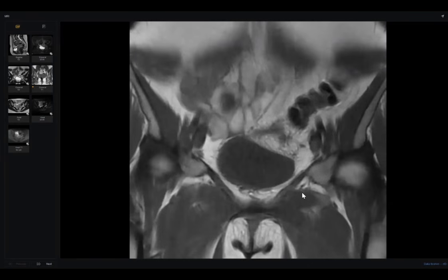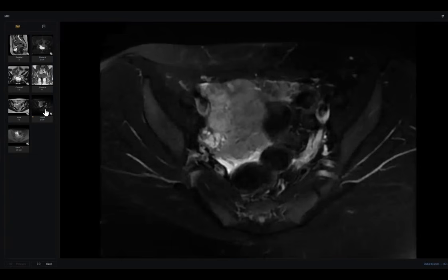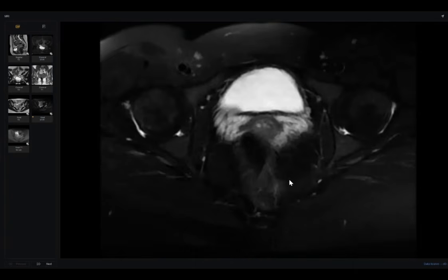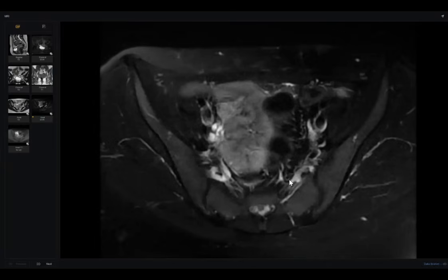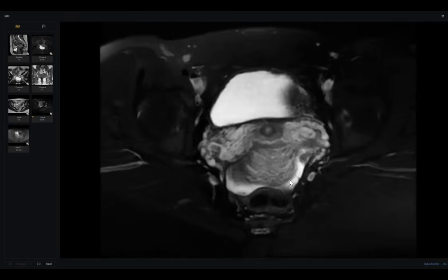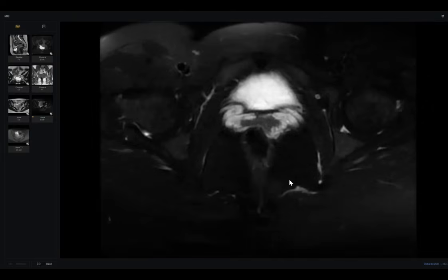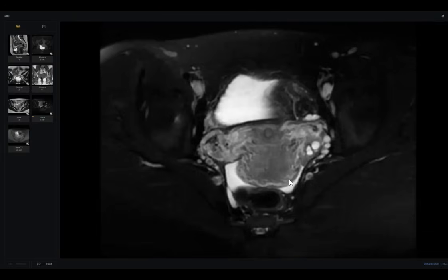I'm not able to find any significant finding in these images. Can I have a look at the other star images as well, just to have a look? If the patient has undergone any other investigation prior to this, any ultrasonography, if available, I would just like to have a look before, in case there were any significant findings of relevance. What do you think, is it acceptable to request ultrasound pelvis after MRI?